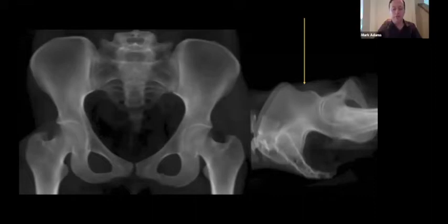Posteriorly, the spinous processes of the sacrum should be midline, the foramina should be symmetric, and if there is no scoliosis and the patient is lying flat, the similar lumbar spine features are helpful too. In the setting of a pelvic ring injury with deformity, one needs to key in on the posterior structures to know whether or not the film is well-centered. It is difficult to characterize deformity without a well-centered image.